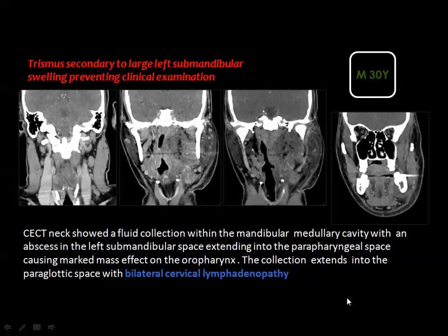And this is another example which represents a big abscess in the parapharyngeal space region. Here, this is the parapharyngeal fat on the right side, which is good. And here you see a big lesion, which is mainly of fluid density, containing some air loculi, and is related to an inflammatory lesion in the adjacent mandible. And if you look carefully, then you see some of the stranding and obliteration of the subcutaneous fat.